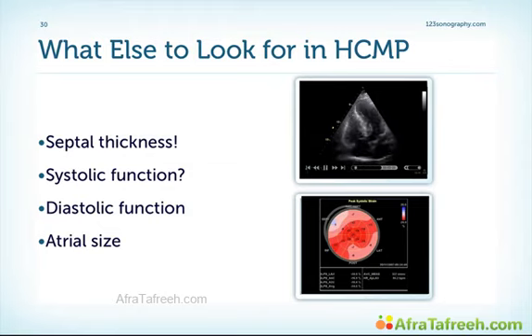Important, assess diastolic function because it correlates well with the symptoms, and it also shows a degree of elevation of the left ventricular filling pressure. And assess the atrial size, because patients who have enlarged left atria are at increased risk for atrial fibrillation, and this is very detrimental in these patients since they rely very much on left atrial filling caused by atrial contraction.